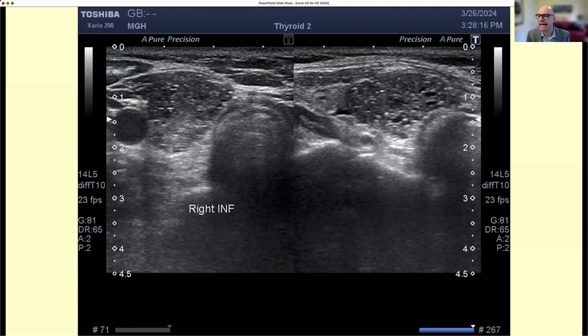As I said, there is a continuum between real artifacts and what we call microcalcifications or bright reflectors. So I will give you the benefit of the doubt. I want to stop here to see whether there are questions about this, because this is a very sticky point. It's one of the reasons why, when you look at studies, microcalcifications have great specificity, but when you do it in practice, everything gets called microcalcification and it gets very diluted.